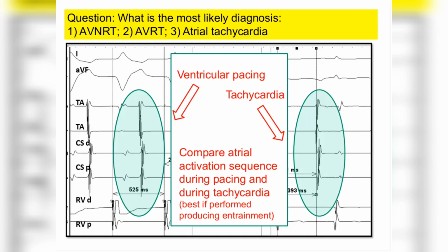Absolutely. If we have only 2 recordings, as in this case, if we see the finding, it is okay. If we don't see it, we have to look more. We have to repeat the maneuver having recordings at other sites. Oh, perfect. Thank you.